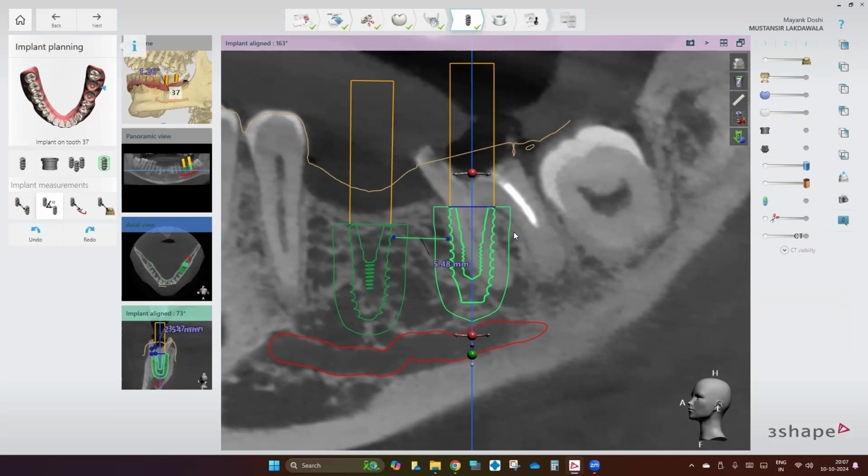Second, this is the primary reason why our guided implant planning will give the doctor at least 50 Newton centimeter torque, because at the end of the planning, they will not have a full khacha. What most of the dentists forget while planning implants is, तुमको ऐसा लगता है कि फर्केशन इज द ओनली बोन लेफ्ट, इसलिए तुम जाके उसमें ऑस्टियोटोमी प्लान करते हो.